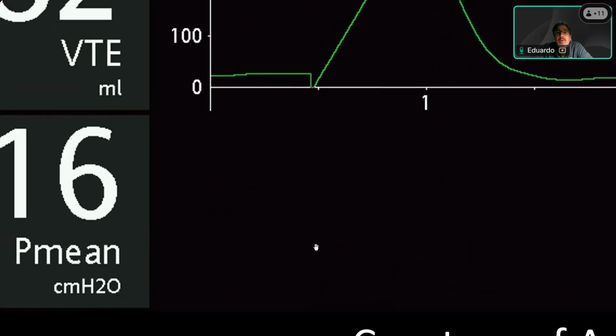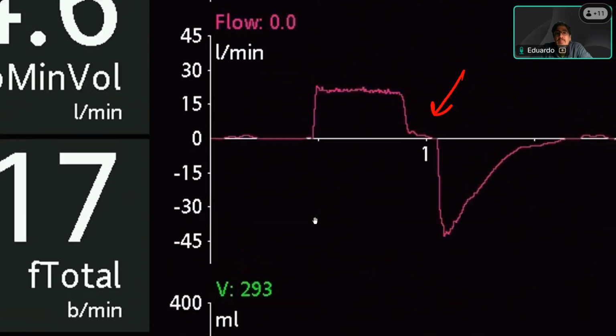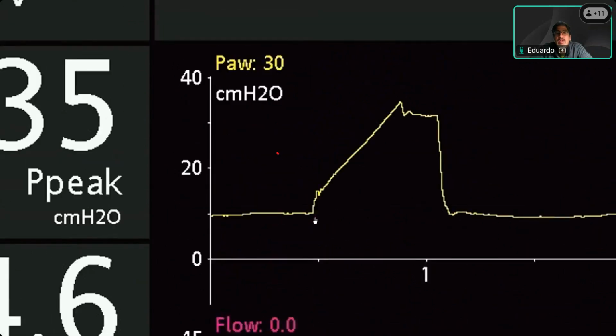And I will point out that exactly at that moment in time, there's no volume being delivered, a minimal amount of volume. And so if I come exactly up, I'm keeping the hand there, you see the flow go up and you see the pressure up. So in this case, this is all resistive load. This step up is resistive load.